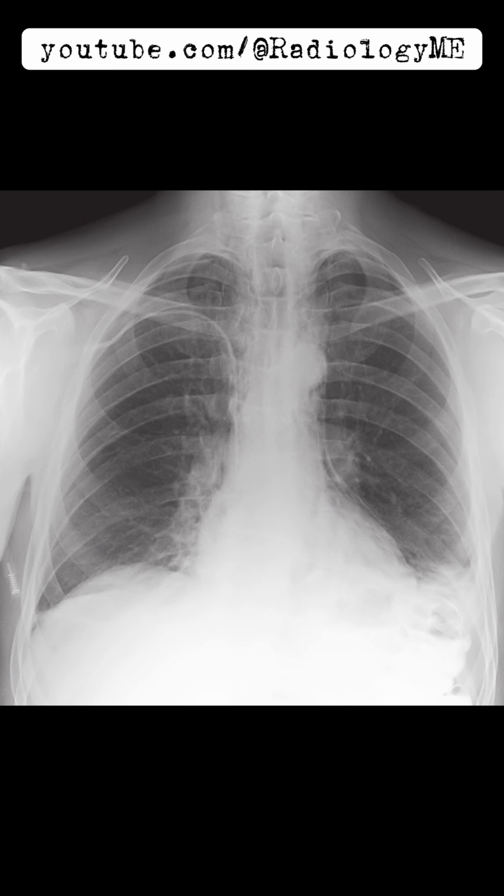What's important here is that there's no gas evident in the neck and no pneumothorax, which are details I'm actively checking off my mental list as I go through this. This rules out a cervical source of air or a pneumothorax contributing to the mediastinal gas.